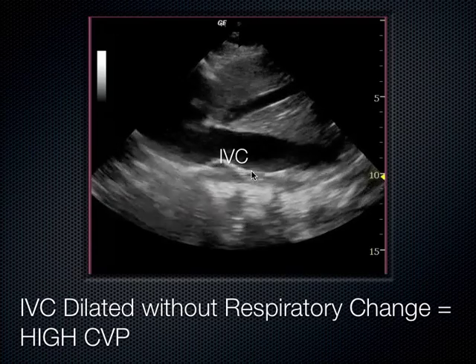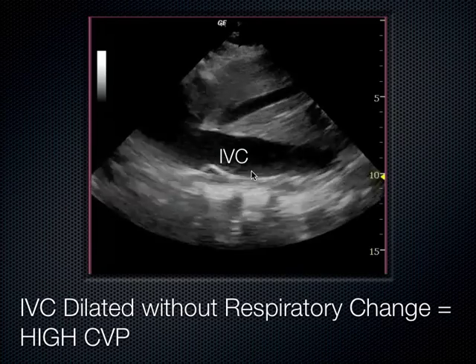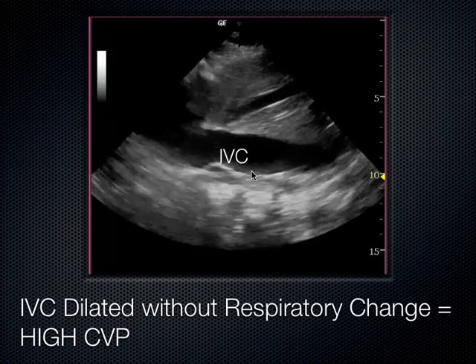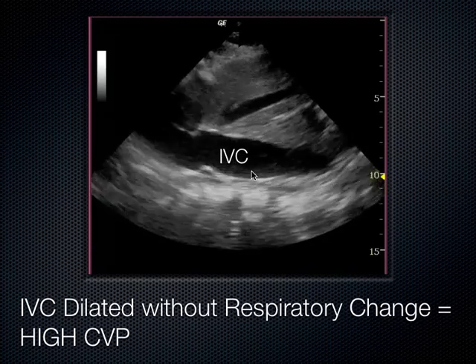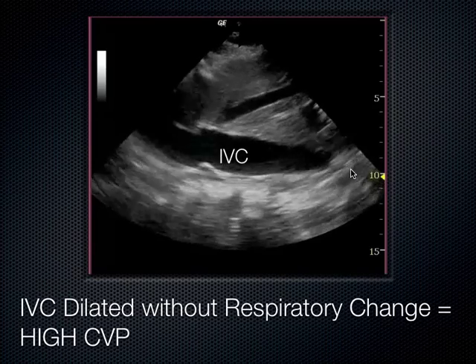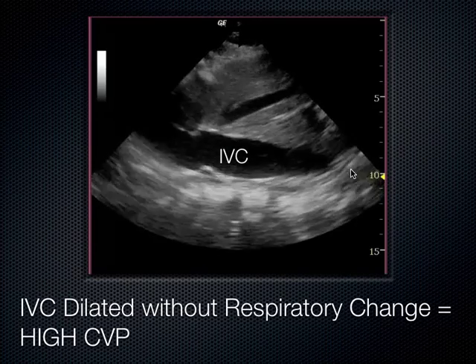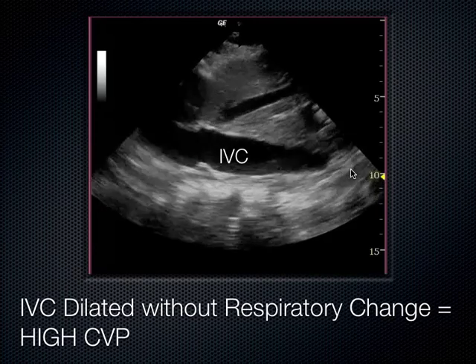I'm just throwing this out there. It's going to come up over and over and over again. I want you guys to be aware of it and how powerful that can be. Any questions about the IVC, CVP stuff? Okay. Yes? So when you float a filter, where is it going to land? The filter lands much more distal to this. Okay. Usually down lower, distally, not underneath the liver, but distally, typically.